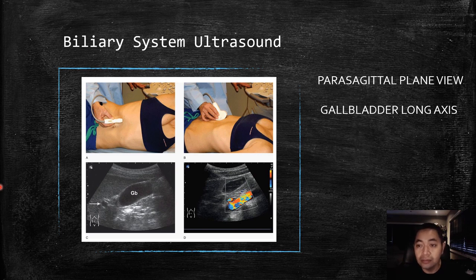The gallbladder and extrahepatic bile ducts are easily seen in transabdominal ultrasound. The intrahepatic ducts are, however, usually too small to be seen if they are not dilated.